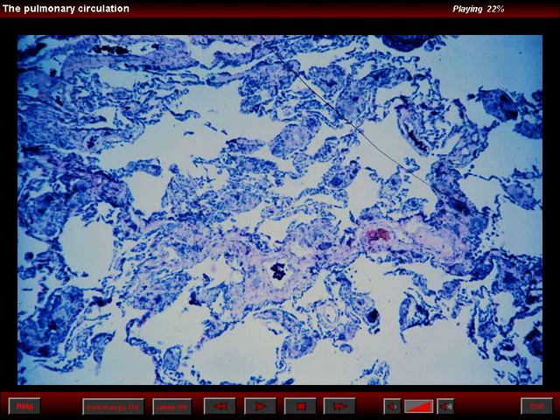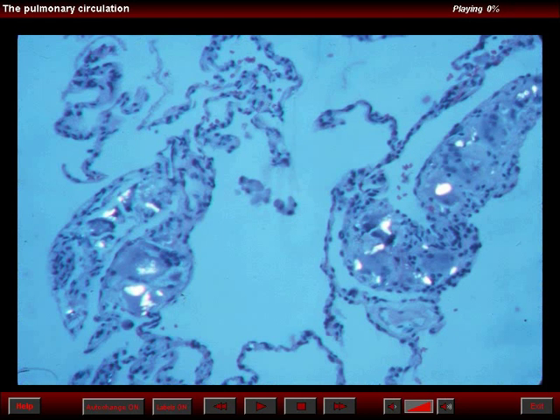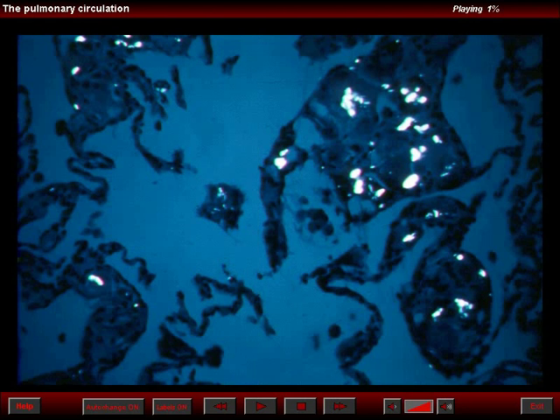A biopsy of the lung revealed evidence of emphysema, but note also obliteration of pulmonary arterioles. Examination of the lung using polarized light shows the birefringence of talc granules that were seen occluding the pulmonary vascular bed. This histological section shows that the talc emboli showed birefringence when the slide is viewed with polarized light.